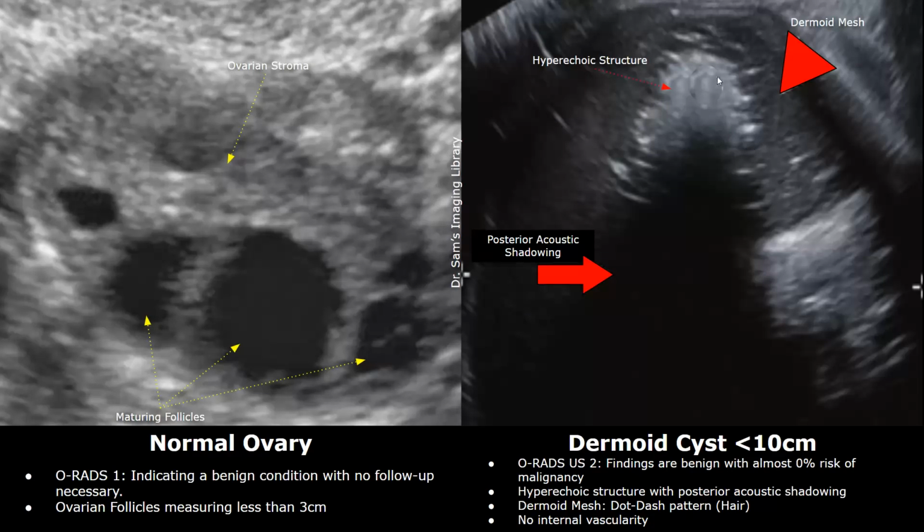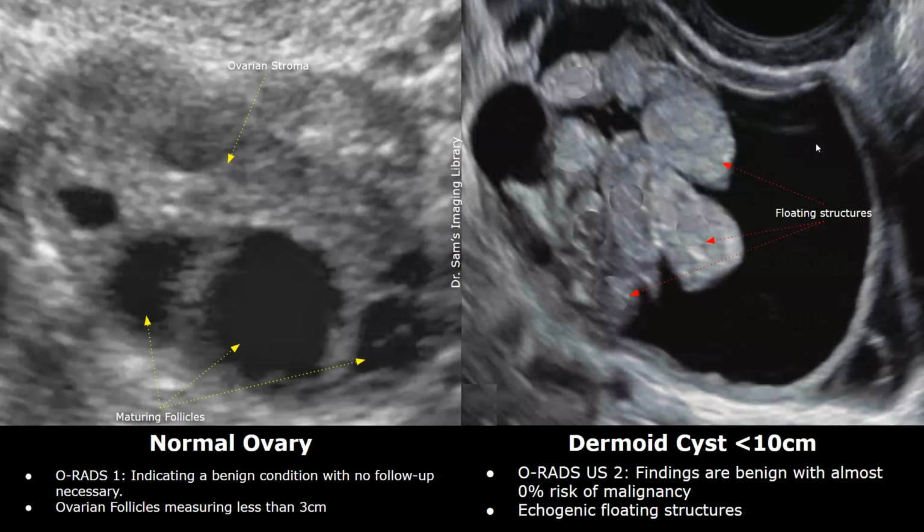Dental structures usually appear hyperechoic and have posterior acoustic shadowing. This dot dash pattern is called dermoid mesh. This appears due to the presence of hair. Dermoid cyst will have no internal vascularity on color doppler. Echogenic floating structures may also be seen within some dermoid cysts. They could be either fat or even brain tissue.